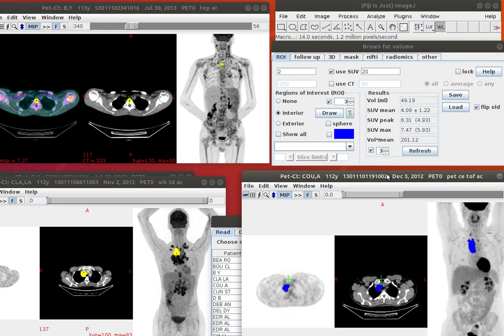Okay, now again in general, if I go from study to study, I want to turn off this tracking business. Over here, and you can see that the blue dots will follow what I tracked on, what I asked to. And here I asked for the 3 view, not for this, not for the main.